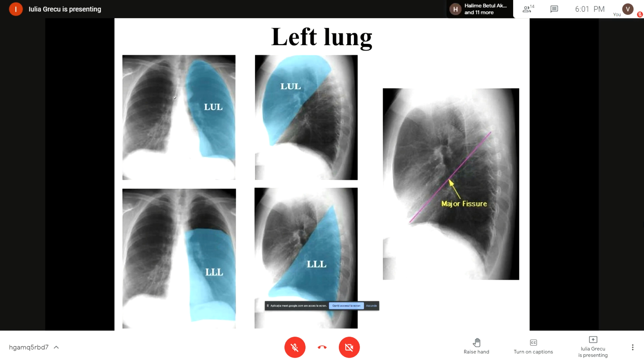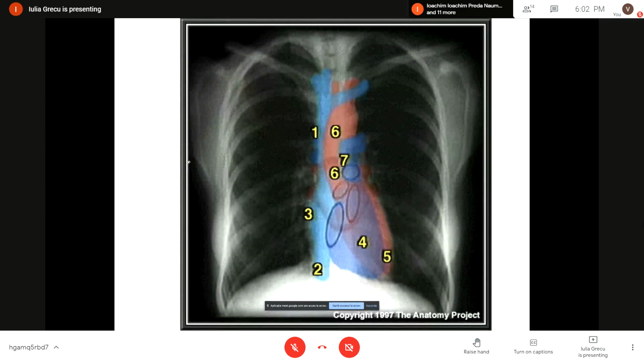Okay, the deepest structure that we can reach studying the chest X-ray is the mediastinal contour and silhouette, which lies in the center of the thoracic cavity. What we analyze when we look at the mediastinum are its edges. There are a few vascular structures that form the edges of the mediastinum, and you will have to keep them in mind, because every time one of these edges is modified, we can think of the underlying structure that determines the change.